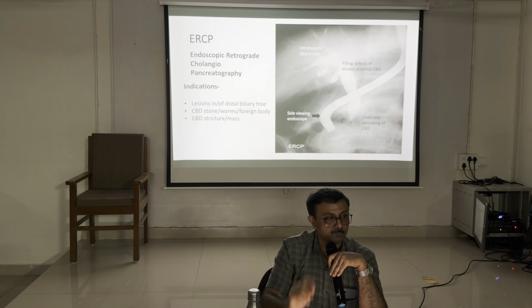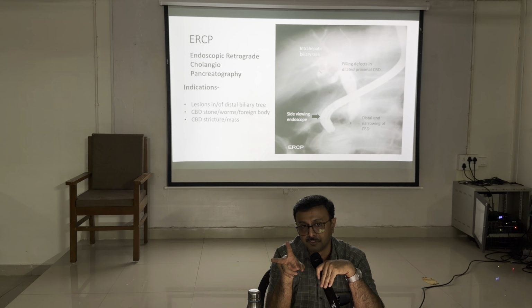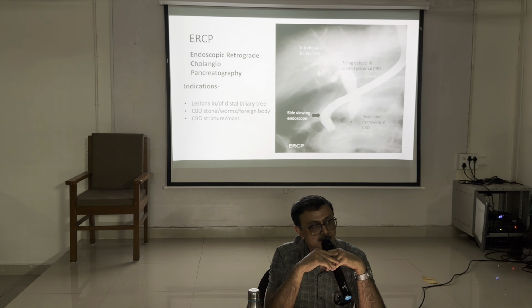If there is cannulation of the ampulla of Vater, both can be visible. But with isolated cannulation of the CBD only, the CBD and intrahepatic ducts can be visible.